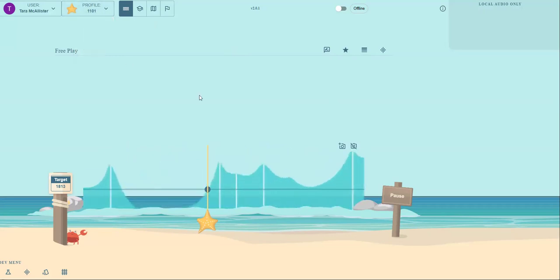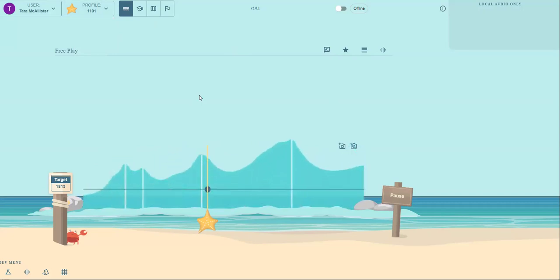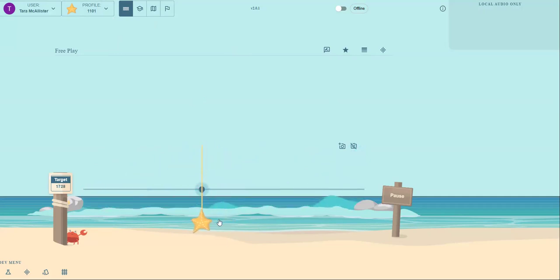That information is used to look up reference values for the third formant frequency for typically developing children of that age and sex. However, the slider can also be adjusted to make practice easier or harder.